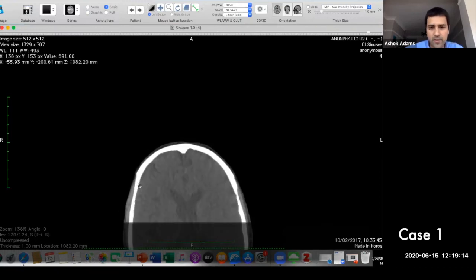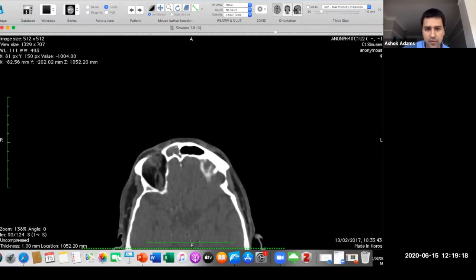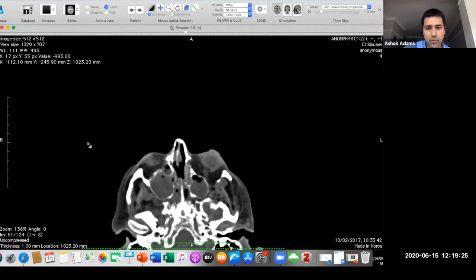So now for some of the more interesting stuff. I'm going to show you a few cases where we'll apply some of that. I'm going to start off firstly with this case. If you remember anything from this 45 minutes, it is this case. This is what we drum home into our radiology SPRs. In terms of history, this was a patient who had a bone marrow transplant, was unwell, with facial pain.